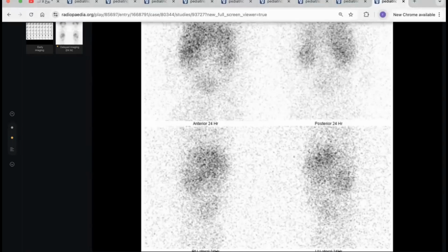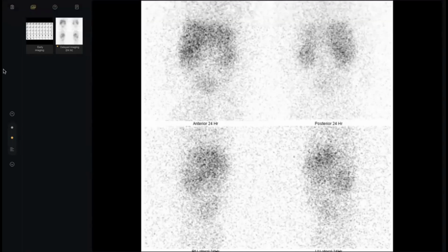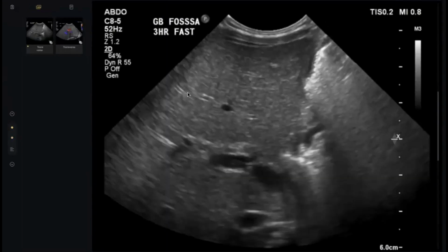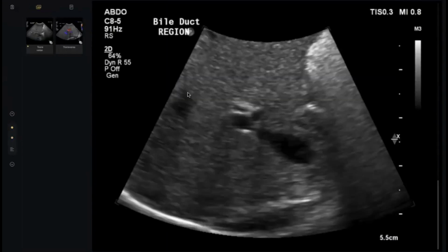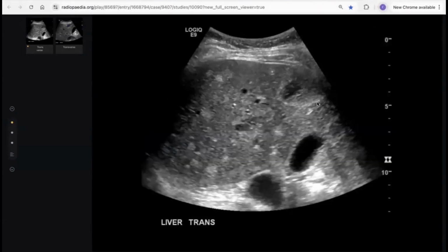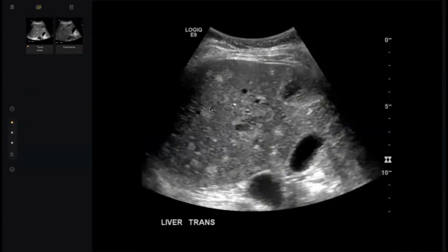Okay, thank you, doctor. Biliary atresia. See, my colleague, here the most striking abnormality is absence of the gallbladder. The echogenic triangular cord sign is borderline, but you can tell the examiner, I suspect this is a sign, in absence of the gallbladder and in correlation with the clinical picture. Next candidate.